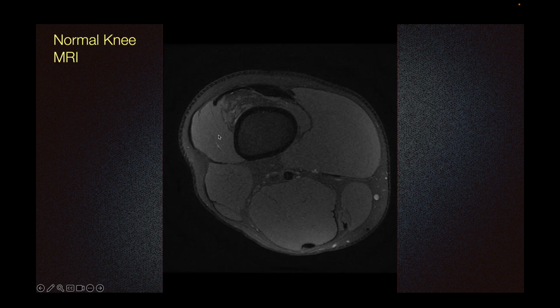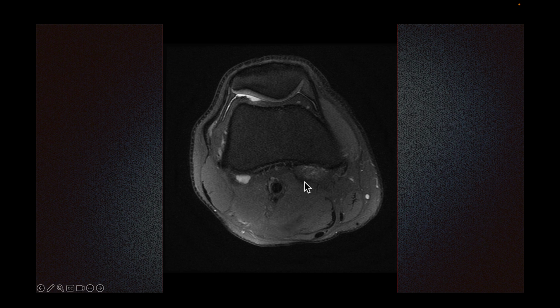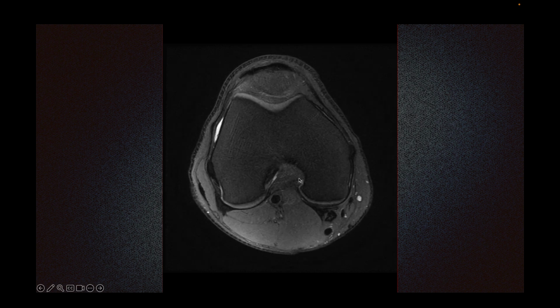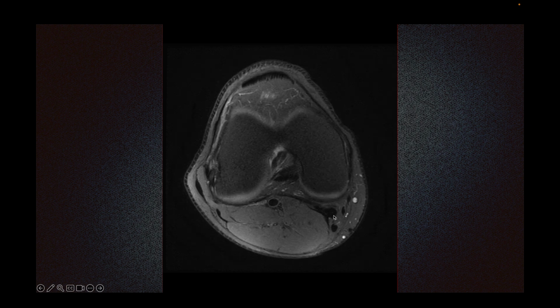Let's look at MRI of a normal knee. This is semimembranosus muscle. This is semitendinosus tendon. Sometimes this look is called cherry on top. So the semitendinosus on top of semimembranosus. The medial head of gastrocnemius would originate somewhere around here as I scroll down. So as I scroll down, this is the medial head of gastrocnemius. And as I keep going down, if there were to be a Baker's cyst, it would originate between the medial head of gastrocnemius and the semimembranosus.